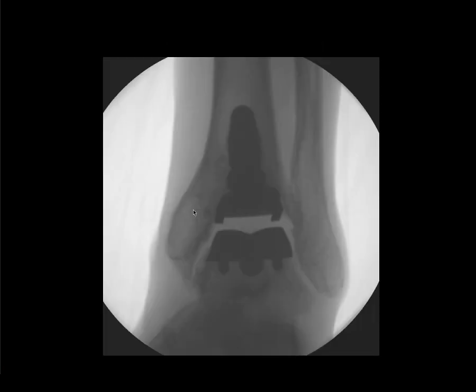And the surgeon can treat this by removing these additional pieces of bone, which is obviously a different operation to revision of the prosthesis. We would anticipate that revision of the prosthesis is not necessary here because we have normal activity. So here we have some preoperative radiographs on that patient. You can see the osteophyte formation here.